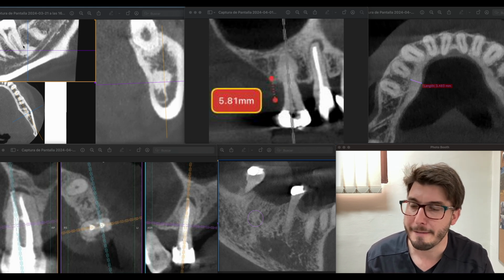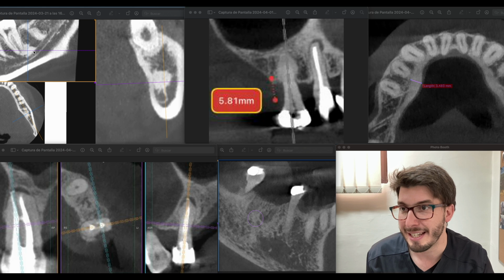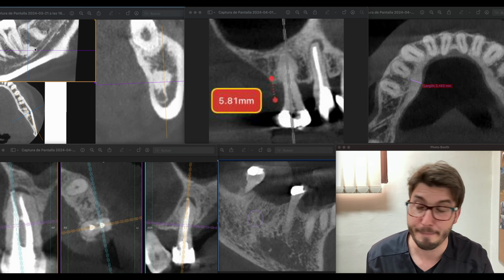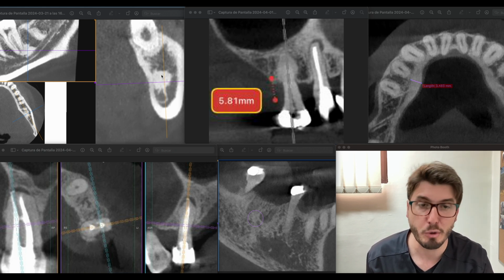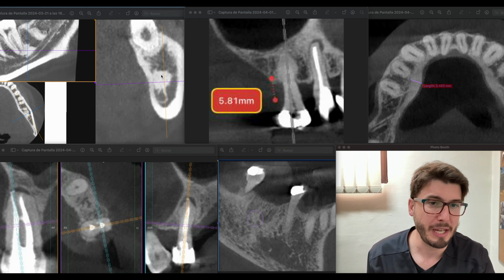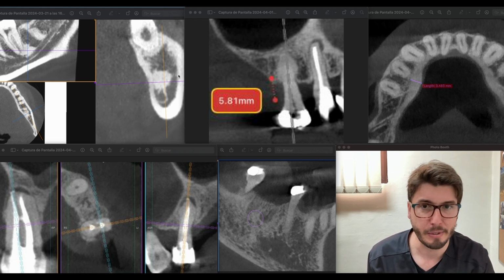And then we have here that this is not the case, right? So this is not so symmetric, and this is more common to be a periapical idiopathic sclerosis, all right? So this would be our first option here in this case, okay? So you basically would follow up the patient to make sure, okay?